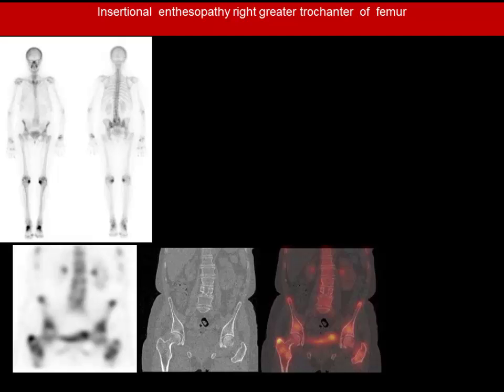The other thing, that's why we keep stressing, and the clinicians don't understand, is that they need to give us history. If I had only unilateral, and on the planar I would have said these are femoral, probably degenerative. But if you've got uptake on the tibial side, you can sometimes see it in unicompartmental arthritis involving the medial plateau. But if you have diabetes, female and overweight, then the diagnosis changes. Then that's a fracture until proven otherwise.